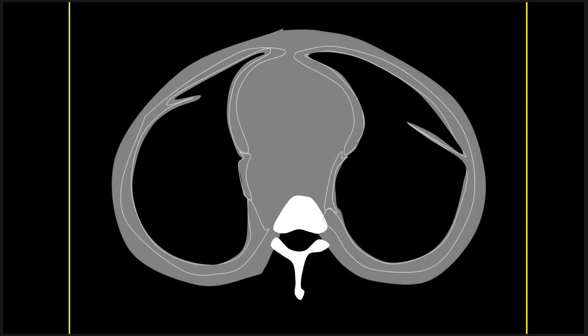Now, the reason that I'm perseverating on this is that I want to point out this area right here, where the heart's going to sit. That doesn't have any air density there. That part of the diaphragm that has air on it is the part that's covered with the lungs, right? So where the lungs sit, there should be black stuff, and where there aren't lungs, you shouldn't see any black stuff.